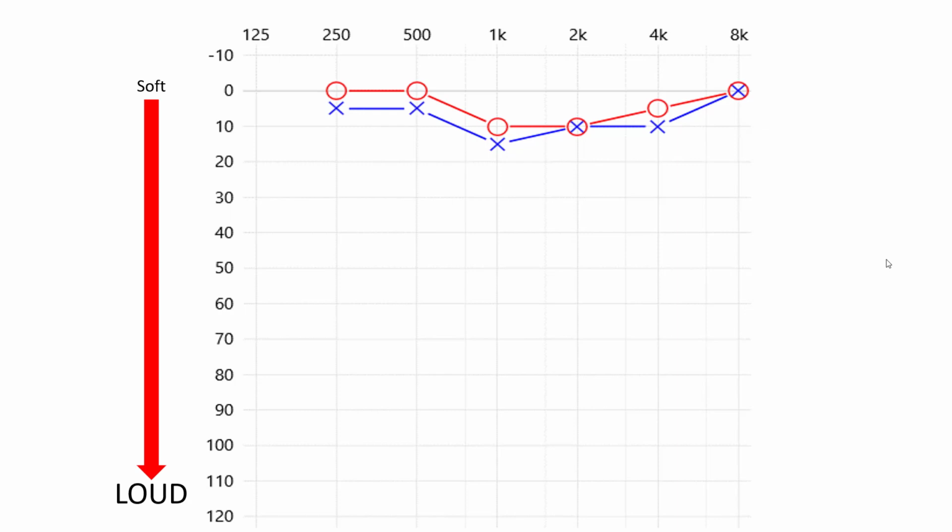Just to give some ideas, sounds of about 20 or 30 decibels are very soft. There we're thinking about a whisper type level. Sounds about 40 to 50 are conversational level speech, and then sounds about 60 to 70 might be like moderate level music. Sounds about 90 to 100, there we're talking about things like construction work at a short distance, maybe a meter, and 120 like a jet plane engine taking off relatively nearby.